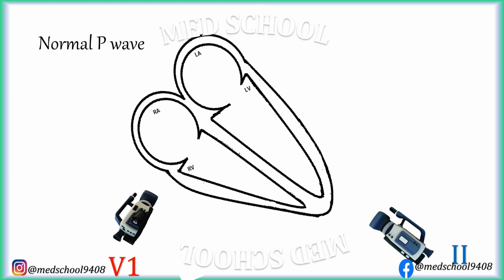As discussed in previous video, right atrial depolarization starts before left atrial depolarization. Vector for right atrial depolarization is directed toward V1 electrode. Hence, lead V1 shows positive deflection. Left atrial depolarization starts after a slight delay and its vector is directed away from V1 electrode. Hence, lead V1 shows negative deflection. Hence, P wave in lead V1 is biphasic with initial positive deflection and terminal small negative deflection.